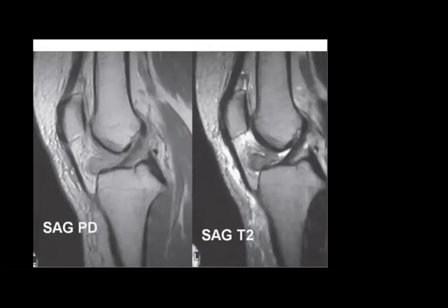So you will suggest that maybe this patient underwent an intervention before, and this will be what is called cyclops lesion. So how do you describe the cyclops lesion? It's like a lobular or nodular lesion, right? In the anterior aspect.